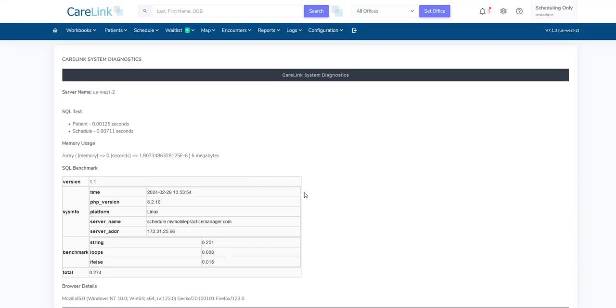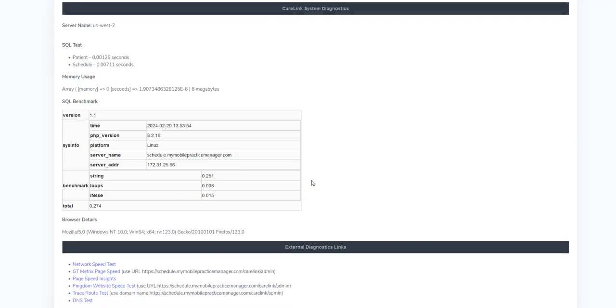So typically, if you're having any sort of system-related issues, we may help you, or we may ask you to go to your system diagnostic page and show us what you see here.